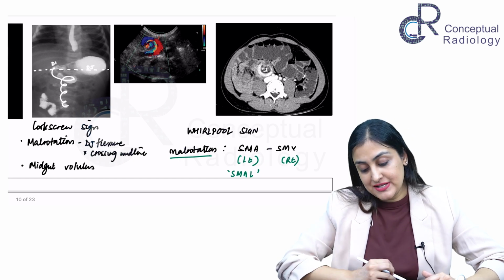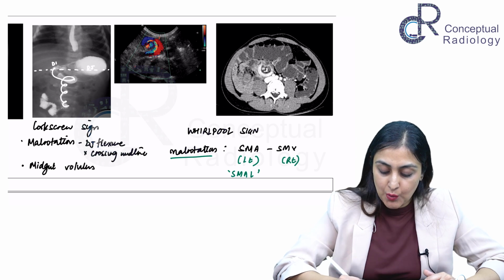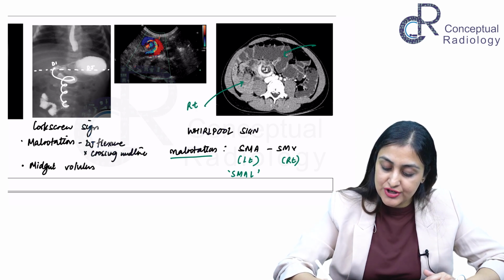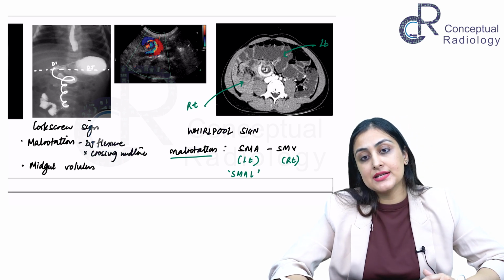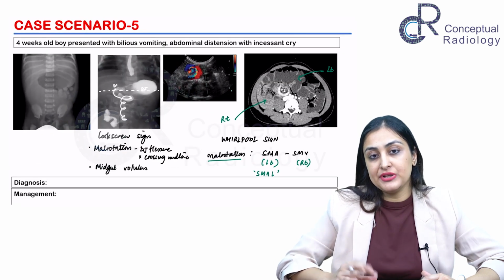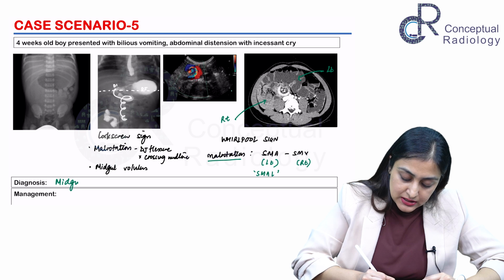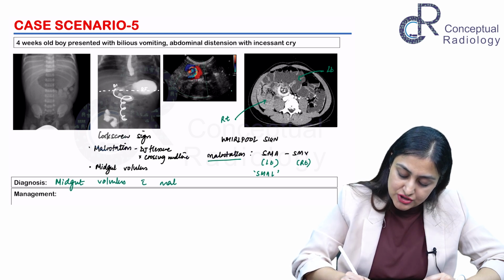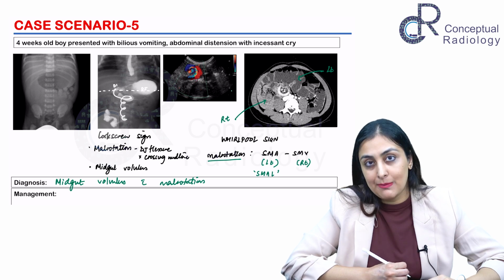of the vessels. Also, if you look at this CT closely, you can also observe how all of the small bowel loops are on the right side and all of the haustrae and the large bowel loops are on the left side, which is again telling you that there is malrotation happening here. So this is basically midgut volvulus, which frequently has malrotation as a risk factor. So any case of midgut volvulus you encounter, you must rule out malrotation.